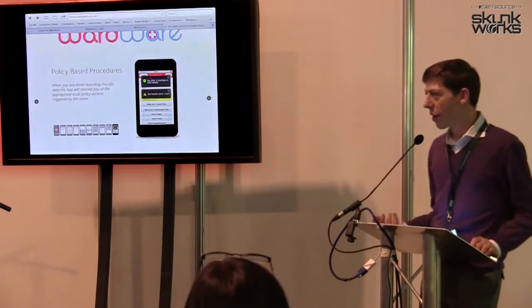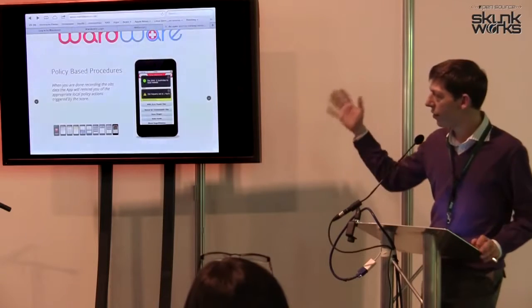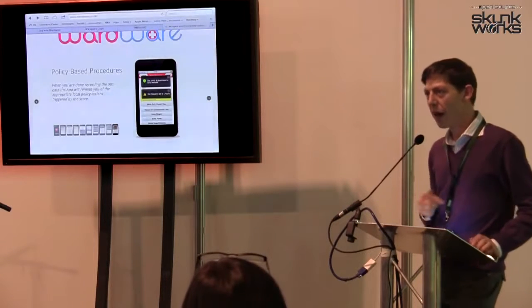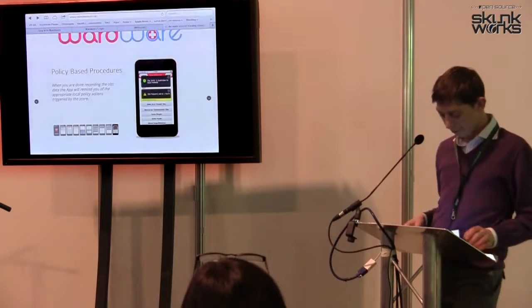And the most important thing about capturing all these observations is actually then responding to them. So the last thing it does is, after you've done your observations, calculates the early warning score for you and then highlights the trust's policy for any given escalation that you're supposed to have based on the early warning score.